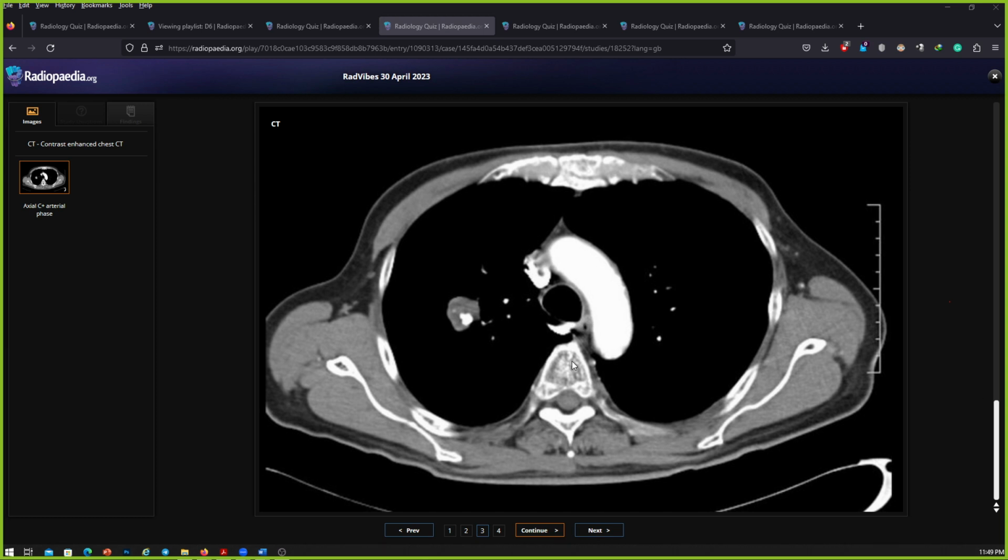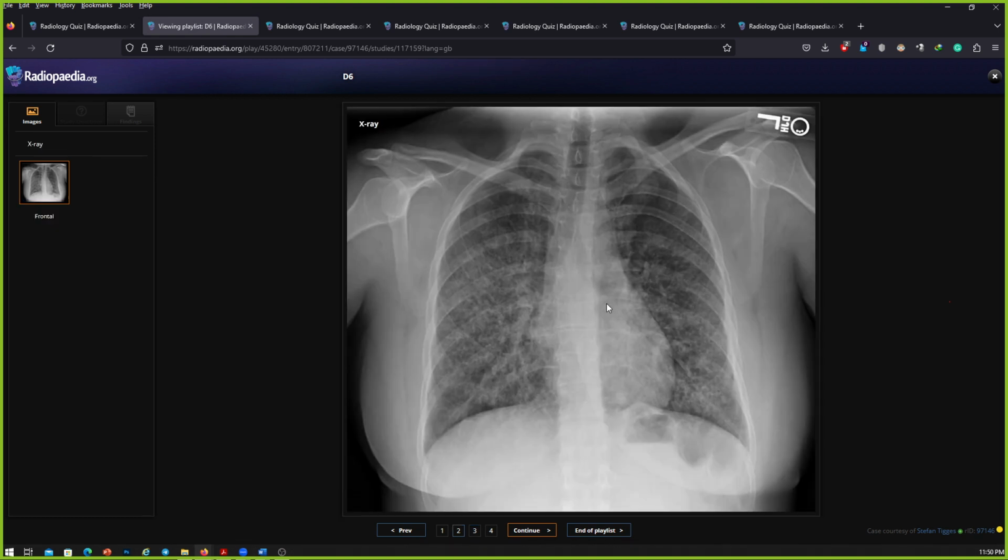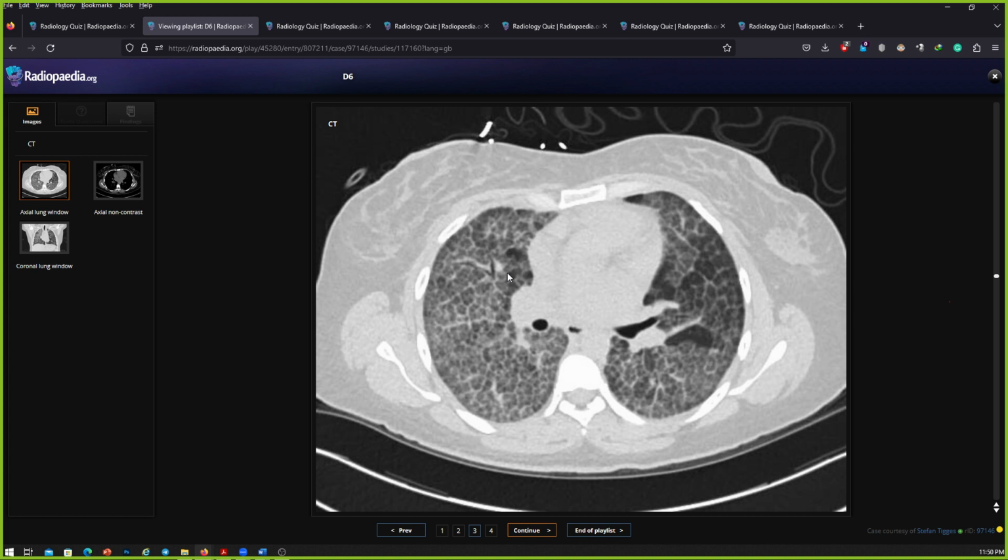Thank you so much. Yeah, so I agree that after I told you that the previous radiograph was the same and there were no changes in the findings in this particular radiograph, the CT was not needed, but generally ask for the CT whenever you need it. Even in this case, you went into a loop of describing the findings on the radiograph and did not ask for the CT scan. This is a case of pulmonary alveolar proteinosis.